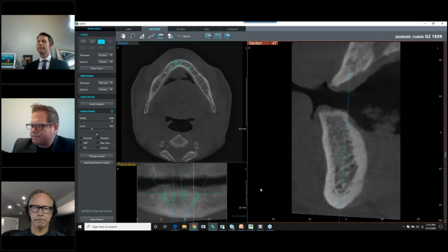Great. Thank you. Jim, can you talk about paralleling? Somebody asked if they could parallel, number 24, 25 as an example.